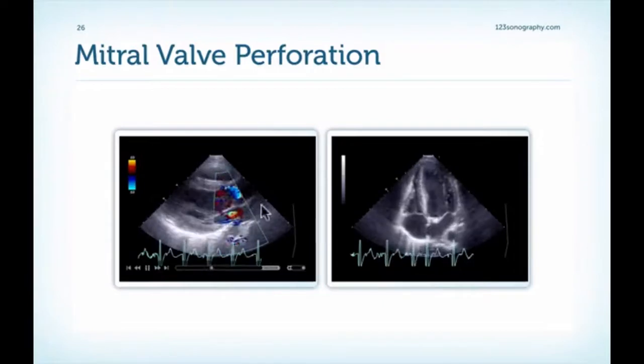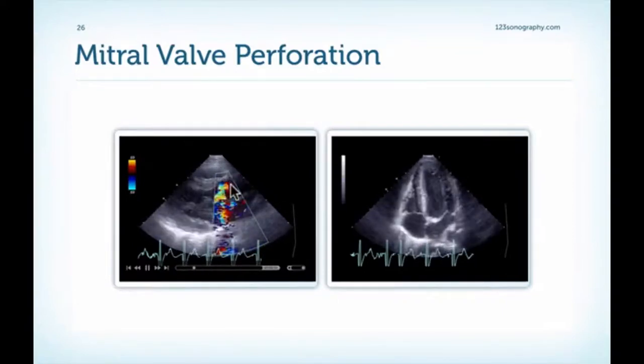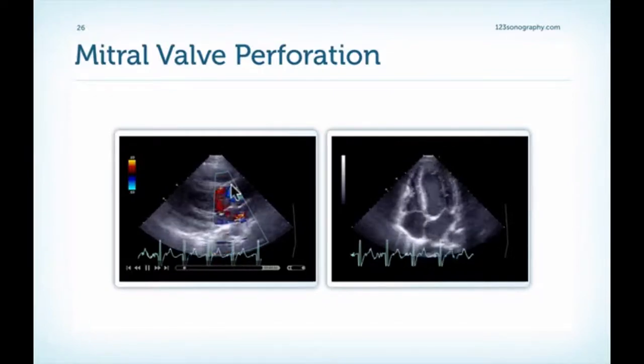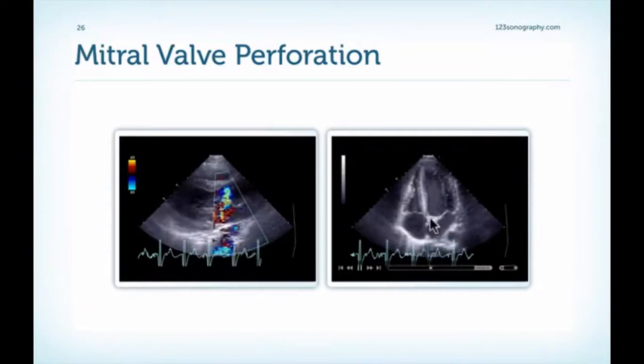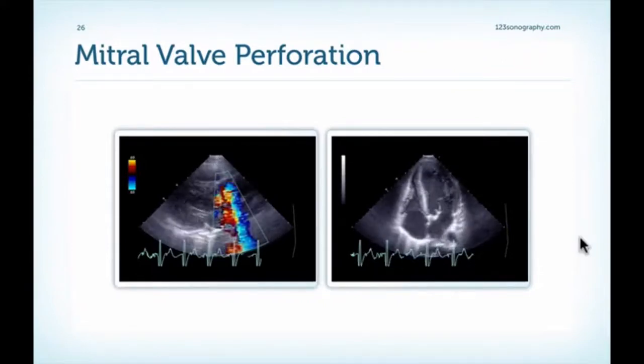One side comment, why does the patient actually have a perforation? Well, he had endocarditis, but not of the mitral valve, but primarily of the aortic valve. And what happened was that infectious material was carried to the anterior leaflet because the patient also has aortic regurgitation, and thereby we had secondary involvement of the anterior leaflet. The patient developed an aneurysm here and a destroyed anterior leaflet, and finally the leaflet perforated.